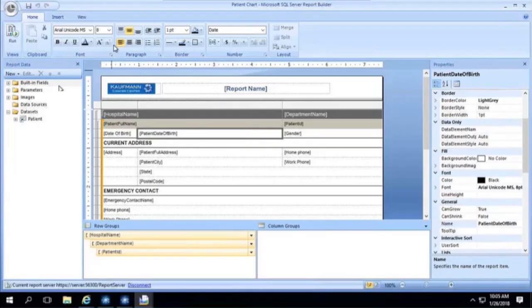Now, with all of your reports, what we've done with Report Builder is give you the benefit of Varian having gone in and created these data models for you. Normally, how a Report Builder or SQL Manager report is generated is you would start out by first creating your own data set. But that would mean you'd have to know what server you're going to be using, what tables are in that server, and how those tables relate. Are there foreign keys, primary keys, things that I can tie them together with? By using our models and the reports that we've given you, you already have all that information there for you. You don't have to create a data set. It exists, and multiple exist.